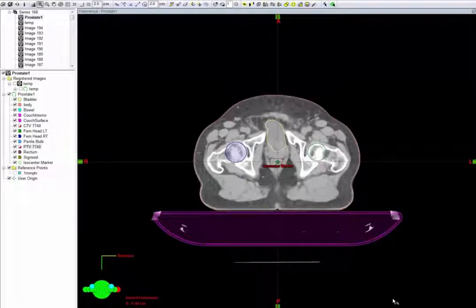This is patient 77771111, prostate only. This is the case of a 62-year-old man with Gleason 3 plus 4 adenocarcinoma involving one of 12 cores, with 40% of that core involved. The patient has T1C for a clinical stage, and his PSA is 9.3.